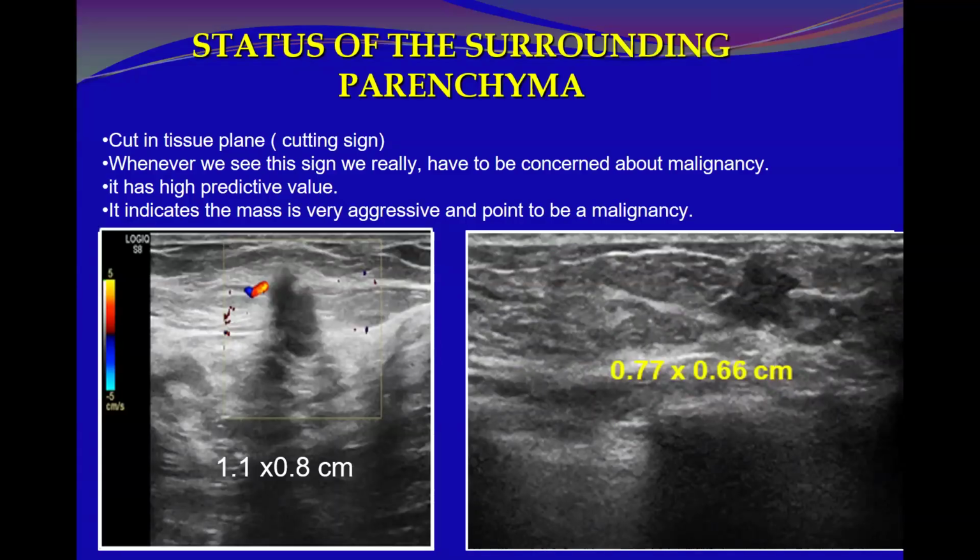So really, you have to consider these signs. The cutting sign is really highly suggestive of malignancy. This is the only sign I found, depending on a single sign to say this is most probably malignant. This is the cutting sign. Even the spiculation, though it's highly suggestive of malignancy, okay.